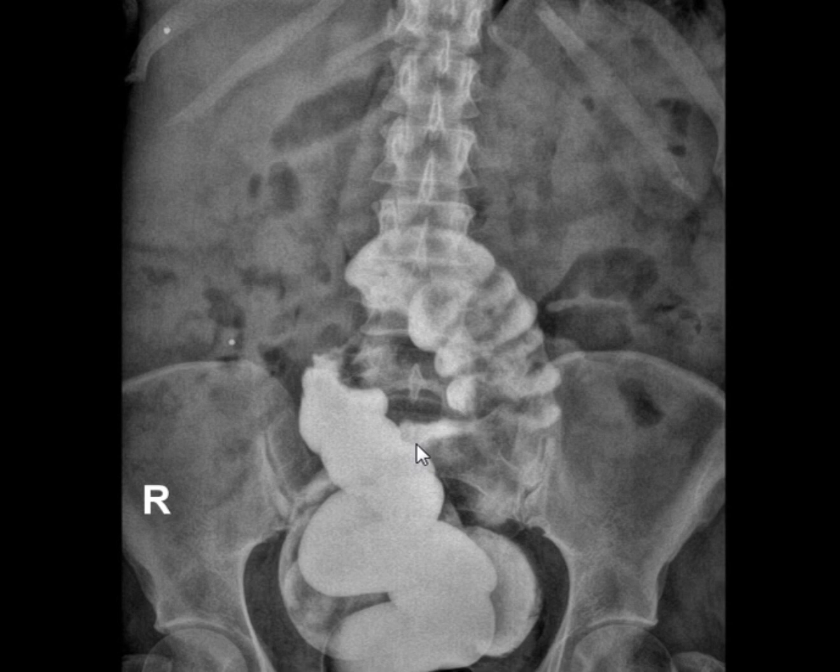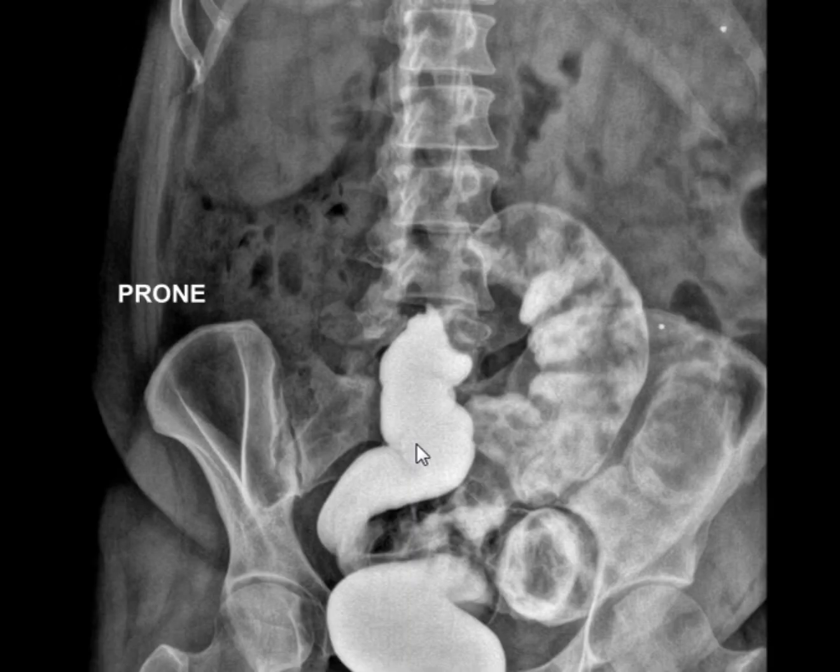But why are the distal parts distended? Because we inject contrast, we inject contrast by enema. So we have to distend it. Normally, it should be distended. It distends to this level when you distend with the contrast. Here it's obstructed or narrowed. We are injecting contrast. It gets distended and the contrast will pass slowly distal to the obstruction. So we can see the rest of the images. For me, if I have this appearance, I stop the exam. That's it. No need to see the whole colon. I have the apple core lesion.